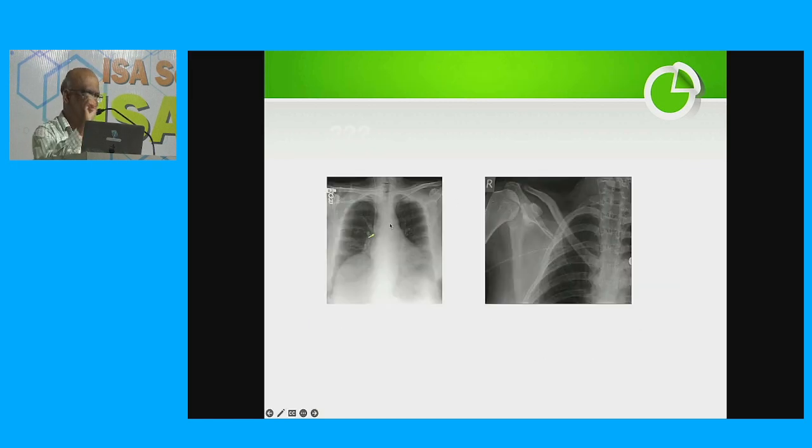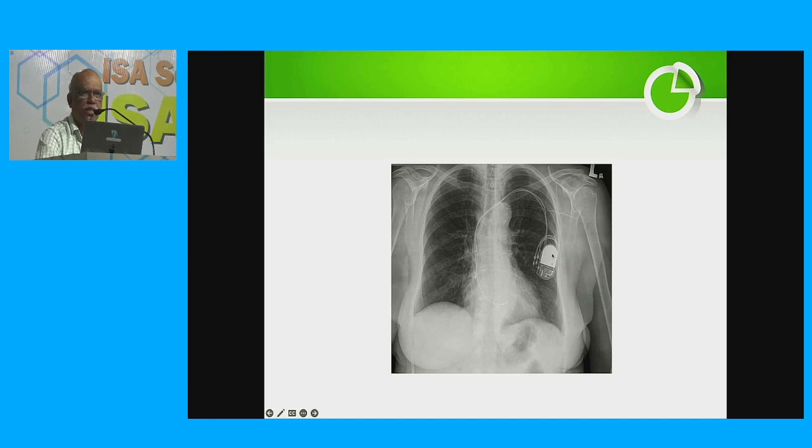And after central venous cannulation, sometimes you may have a doubt. To know the position of the central venous catheter tip, it has a radiopaque line. To know the position, abnormal migration, or whether the tip has broken, you may have to take a chest X-ray. Here you can see the central venous catheter tip. So these therapeutic devices are all X-rays which we take during anesthesia and critical care practice. This is a pacemaker device, pacemaker devices, all those things.